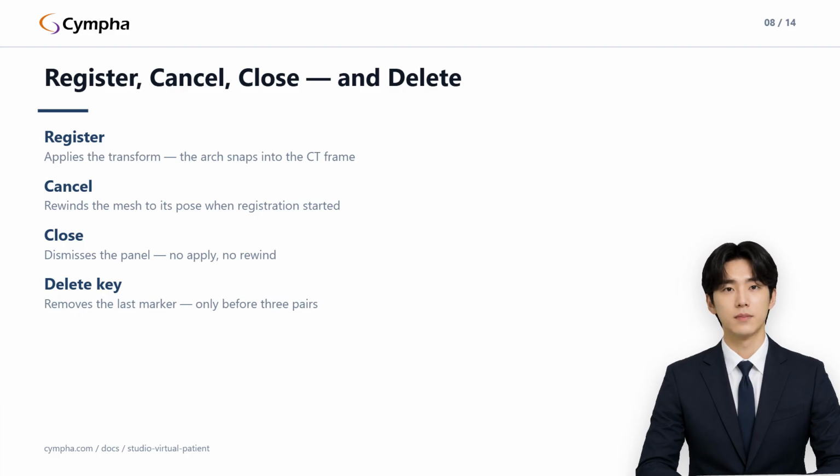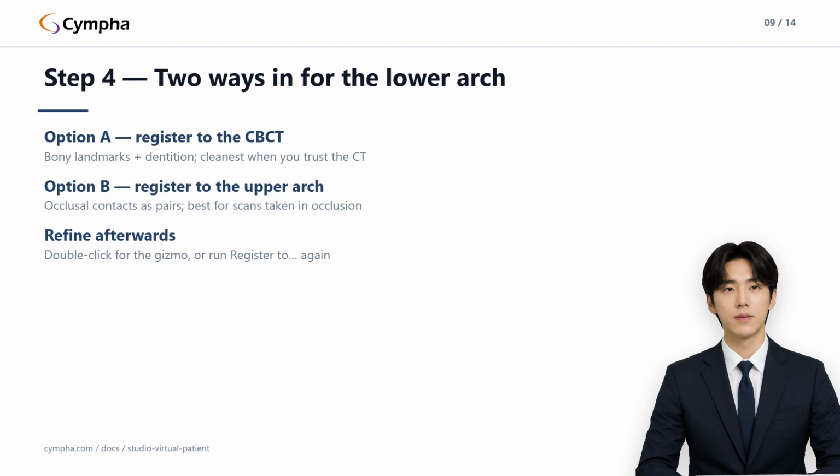Double-click the lower mesh to open the positioning gizmo and movement panel for fine bite adjustment, or simply run Register to again against the CT.